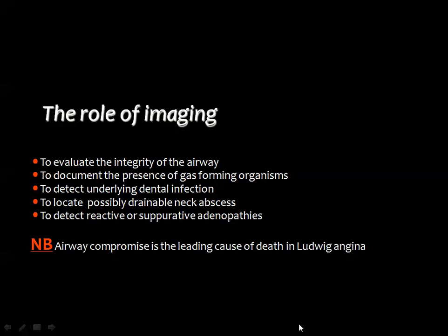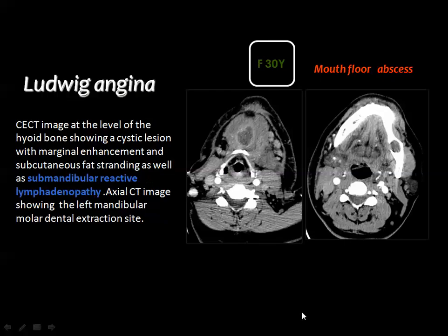Then, as I have mentioned, this angina is a clinical diagnosis, and we may sometimes need imaging to evaluate the integrity of the airway, to assess the presence of gas-forming organisms, to detect the underlying dental infection, and to look for abscesses, which should be surgically drained, and to look for the reactive or suppurative lymphadenopathies. And this is a case of Ludwig angina.